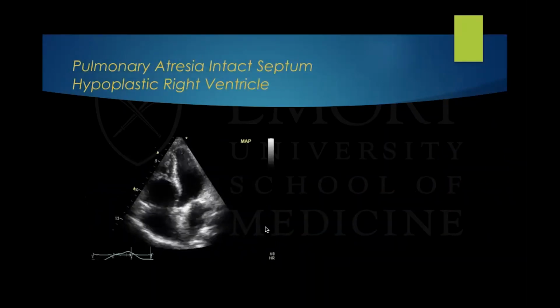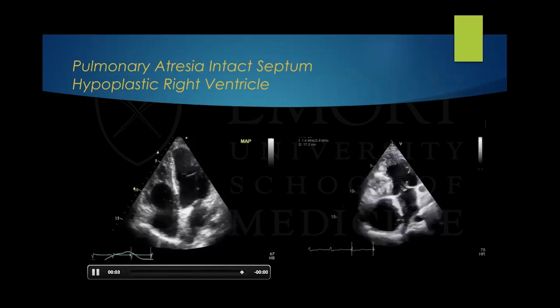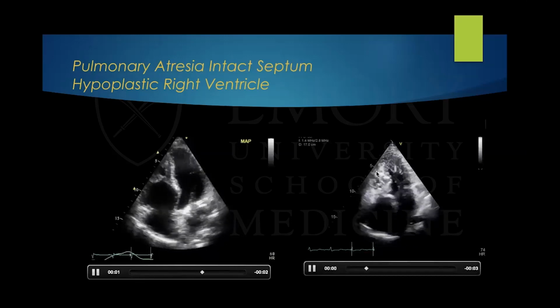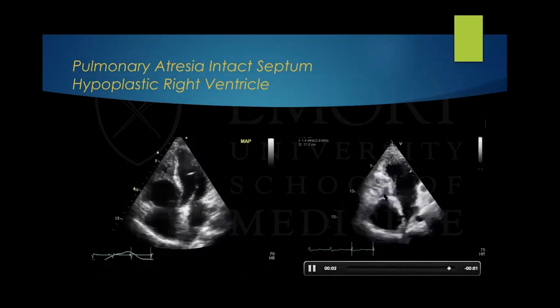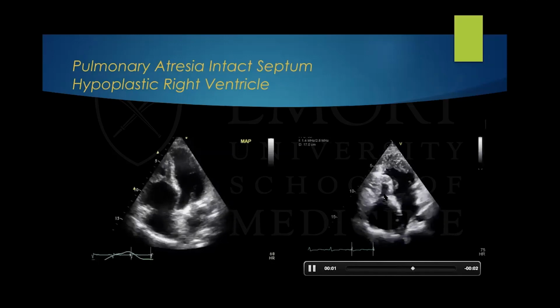In some more severe cases, you will see that the right ventricle is abnormally formed, with only an inlet view and an absent apex. The apex is all hypertrabeculated, so it is not functioning. In the more severe type there is hardly any cavity, and the tricuspid valve is almost, sometimes they remove it.